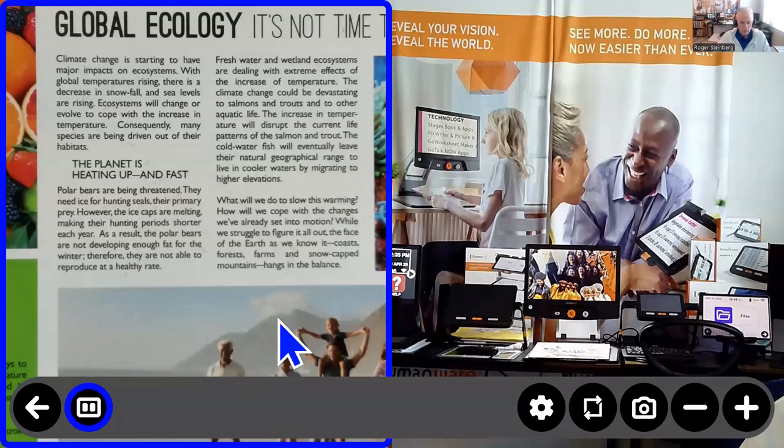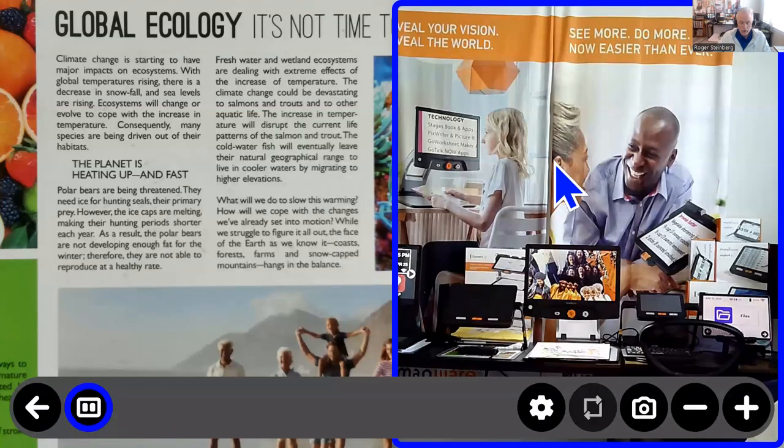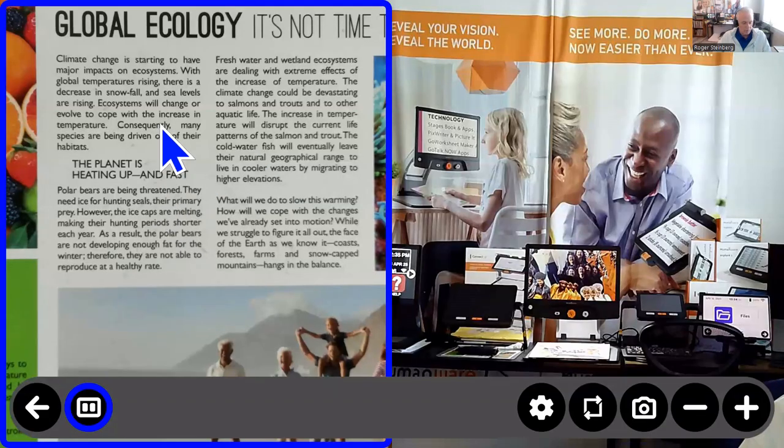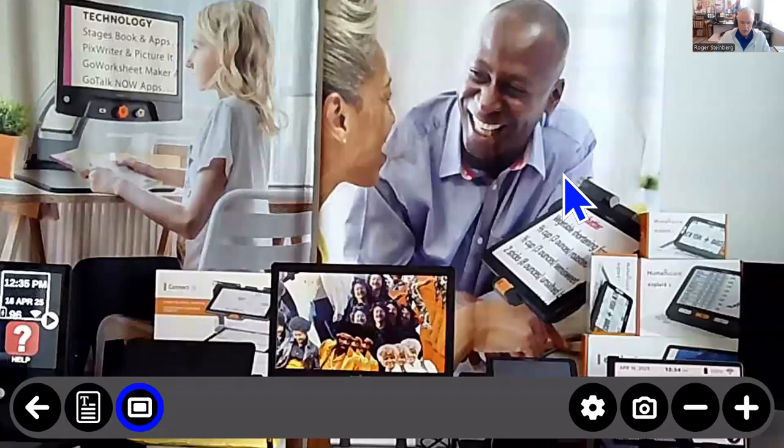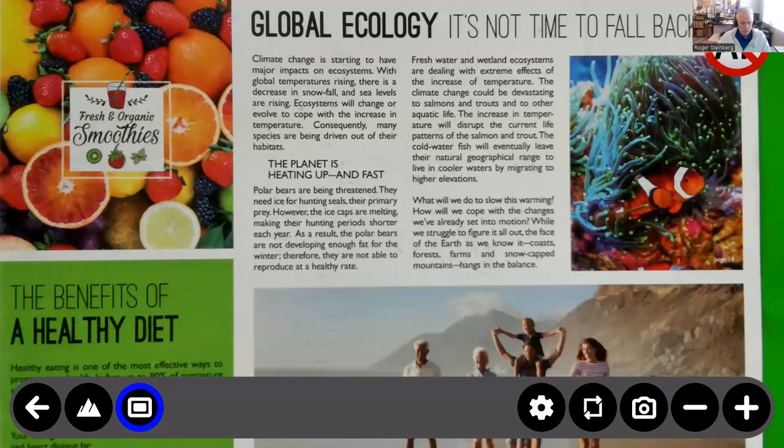I wanted to point out one other thing with this while I'm in my split screen view here. To the right, I'm currently in my distance camera. To the left, I'm controlling my down-facing document camera. Whichever one I'm in, if I double click or double tap onto it, I will exit out of split screen to that specific camera again. I still have the ability to come back, navigate my cameras and get back into split screen. So I think that's going to be a highly useful functionality, but we are looking for feedback on that. So certainly after today, let me know.